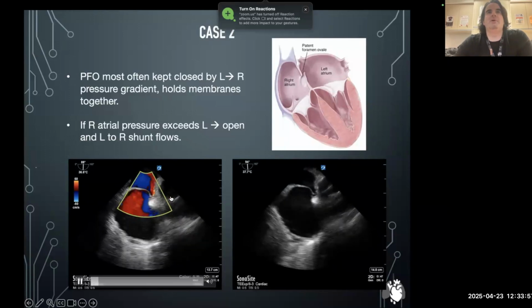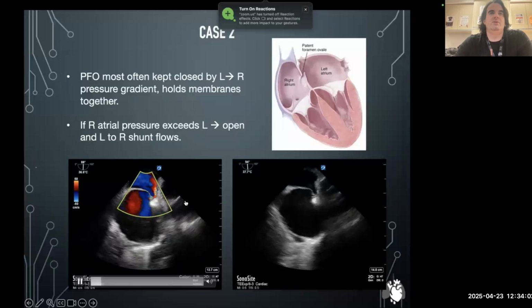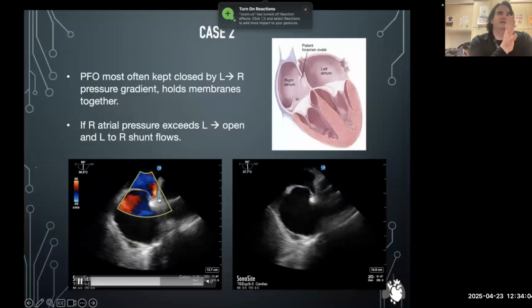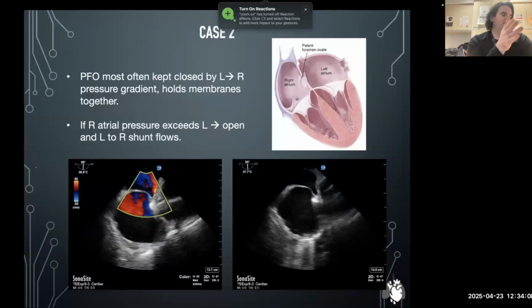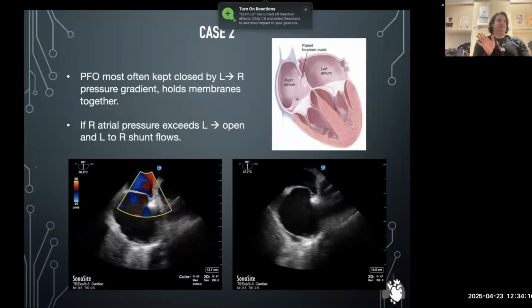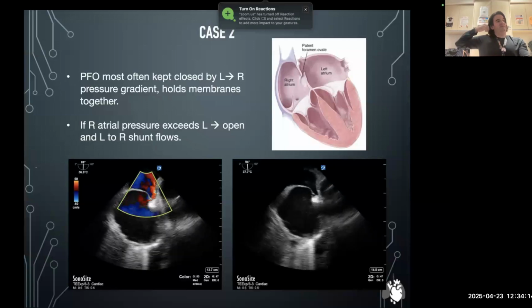This is done with a TE probe, so transesophageal. It's in what's called a mid-esophageal position, with the crystal aligned at 90 degrees and then rotated clockwise. So basically the beam rotates towards the right side. That way it can cut through both cava, both SVC and IVC.